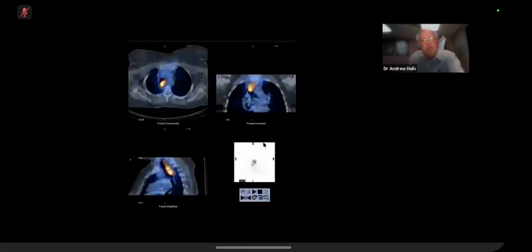And we've got this here. What kind of image would you say this was? This is a fused CT. Is it a SPECT? That's right, yes. That's what I wanted you to say, and it's correct. It's a SPECT CT image. I didn't want you to say it was a PET CT image because it isn't.